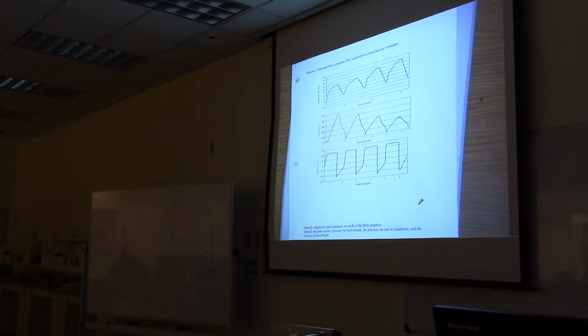All right, now what does it want you to know? Identify the peak airway pressure for each breath. All right, so look at your pressure time waveform and tell me what the amount of pressure that built up during the first breath. And it's going to be an estimate because we don't get exact numbers with the graphs. All right, about 23 centimeters of water.